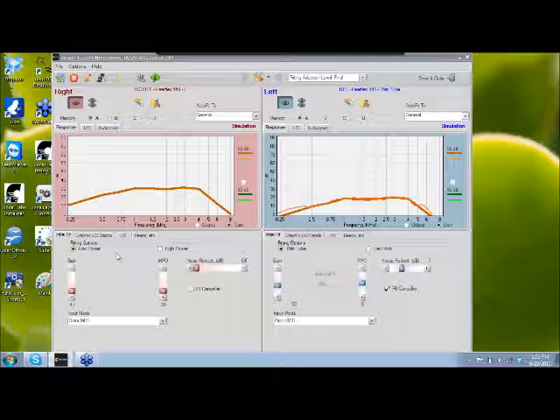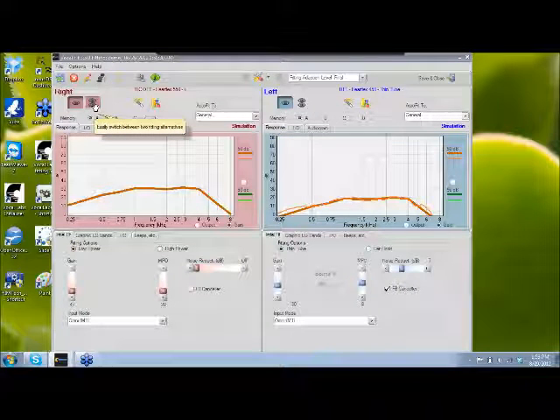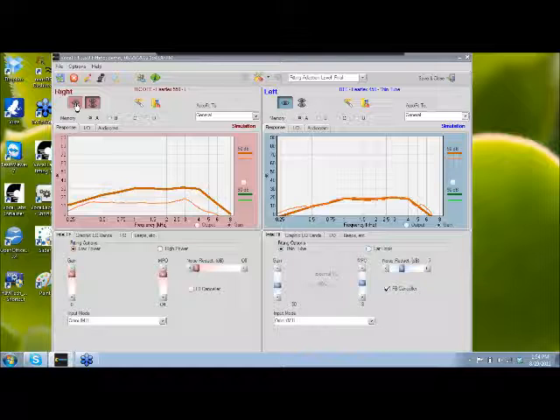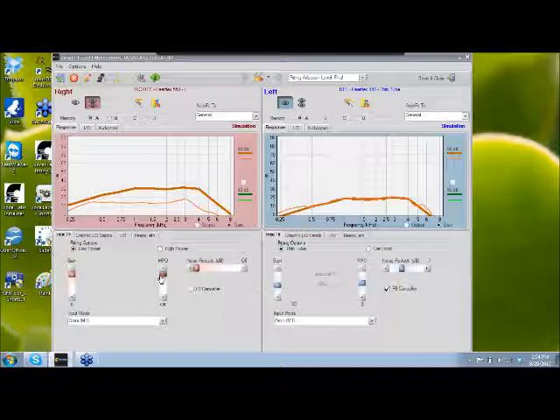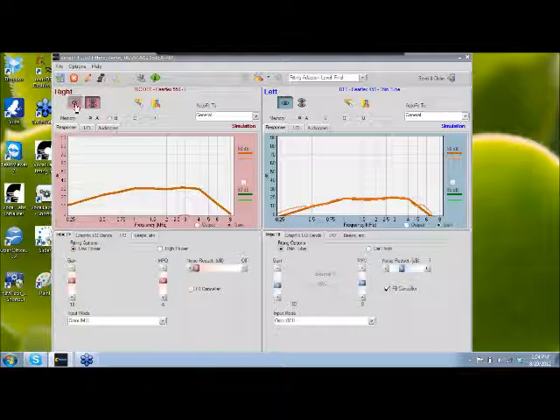Obviously, you would be doing more subtle differences when working with a patient, and then you could go back to the patient and say, now which sounds better? This one, test 1, 2, 3, does this sound better to you? Or this scene, does this sound better to you? It's a way that you can snap back and forth, and at that point, I can now change the second set of eyeballs, the double eyeballs, and they're completely independent. It doesn't copy again. Both scenes stay exactly where you left them.